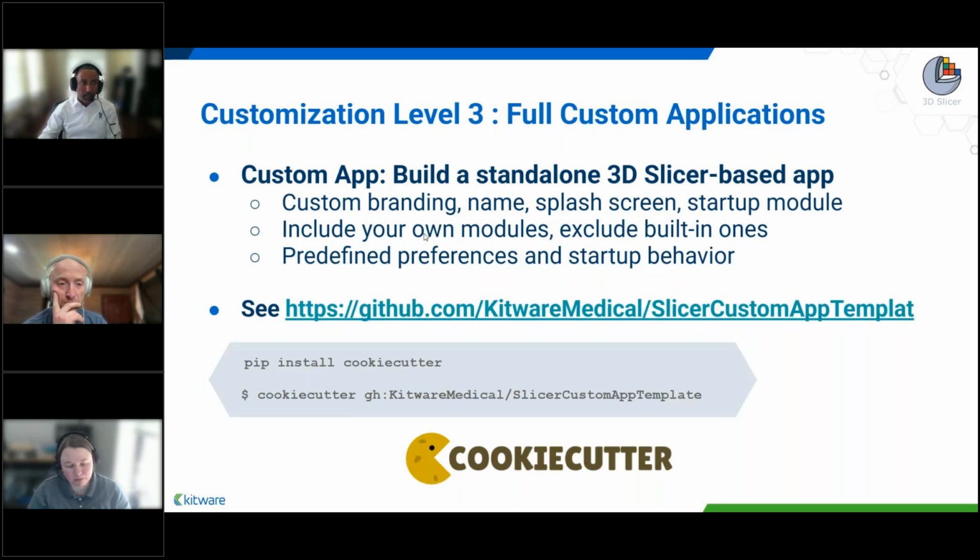However, when you are building the template, you get to choose which version of Slicer you want. You can build any stable version of Slicer into your application, or even any specific commit of the Slicer project. So if there's a very specific version of Slicer that you want for your project, you can easily define that and keep that definition without it being changed as Slicer is updated.